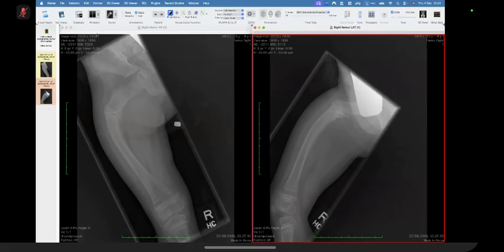Okay, here's a question for you. These dense metaphyseal bands, what could they be related to? So normally they can be a normal physiological finding as well. However, if the patient is on therapy for his underlying disease process, these can appear because of that. In rickets also, we can see dense metaphyseal bands. But in this patient, if the patient has a known diagnosis of osteogenesis imperfecta presenting with this deforming bending of the femur with fracture and these dense metaphyseal bands, it can be because of underlying ongoing therapy for his disease process. Okay, all right.